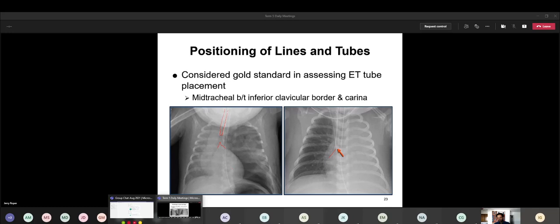Now back to this one. This poor baby has got a left pneumo. So look how it looks really dark right here in this region. And then also the lung markings aren't really that distinctive. You can maybe see a little bit here, but for sure there is a pneumo going on. And then if you look even closer, this right here is a chest tube. So they're treating the baby for a pneumo already. But the pneumo is definitely still there because this is still a lot of air.